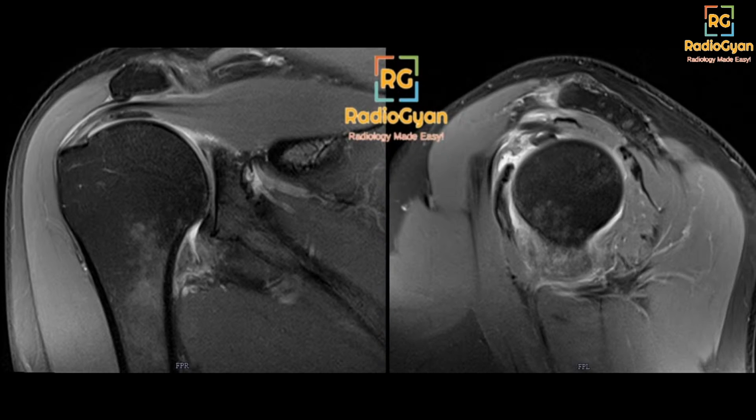Today we'll discuss mostly MSK cases. MSK cases are difficult on just a single image, so we'll try to discuss as much as possible. Most of the time the pathophysiology is quite extensive and not related to that single image. We'll try to do as much justice as possible, but remember that with MSK you have to look at all sequences, all images, and there is always more to the imaging findings.